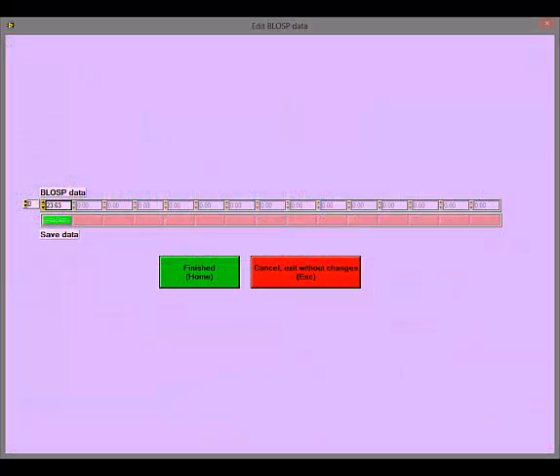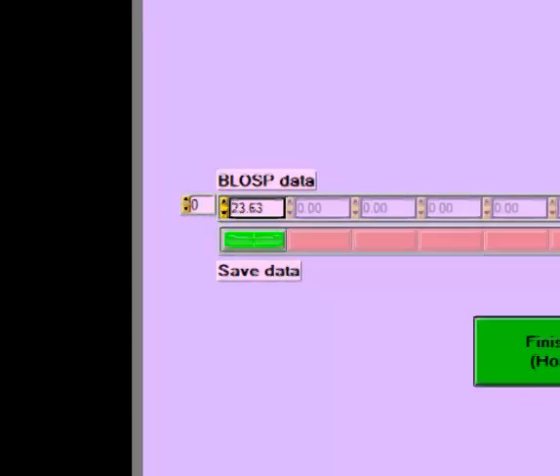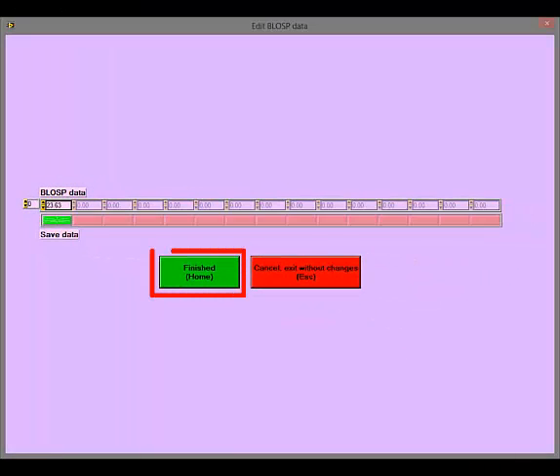In this screen, you can view the basal pressures you have recorded and deselect any that you do not wish to save with the swallows. Click on Finish to return to the analysis screen with your changes saved.